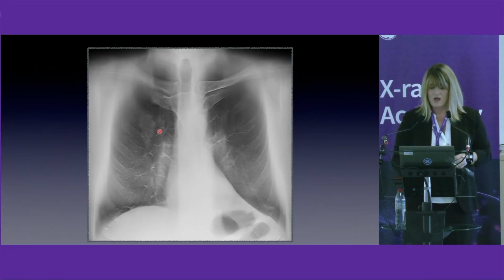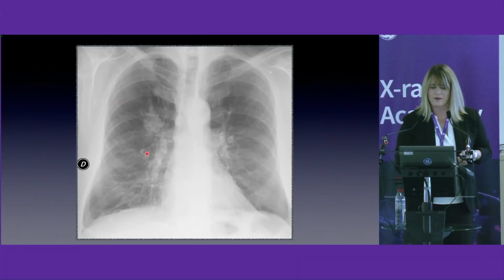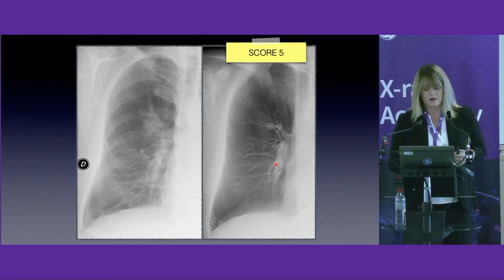So first, at the very beginning, we scored this patient as definitely benign opacity. However, a few months later, this opacity increased. And so we perform another DTS, which reveals a nodule. And so sometimes it can be very difficult to recognize, due to the parallax, nodules just beneath the pleural surface.